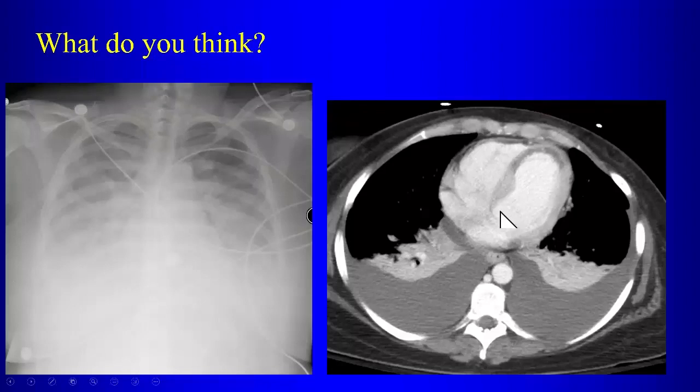Patient shows up with chest pain, short of breath, bilateral effusions, and this. So this patient's in congestive failure, but what is causing the failure? What is this stuff? Is that fatty replacement? Well, not yet. This is an acute presentation, so this is acute infarction. Yeah, so this is an area of hypoperfusion in this patient who's having an acute infarction.